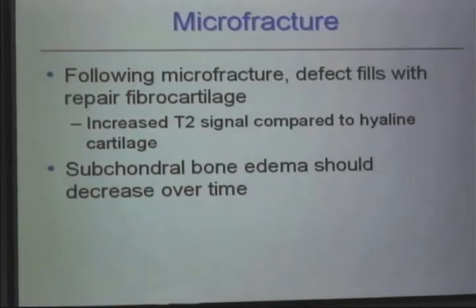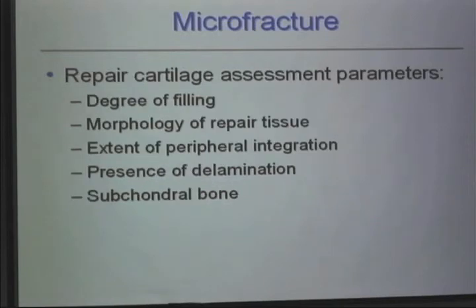Following microfracture, a defect will fill with repair fibrocartilage. This shows increased T2 signal compared to hyaline cartilage. The subchondral bone edema should decrease over time following the microfracture. So we'll look at the degree of filling, the morphology of the tissue, the extent of peripheral integration, etc.